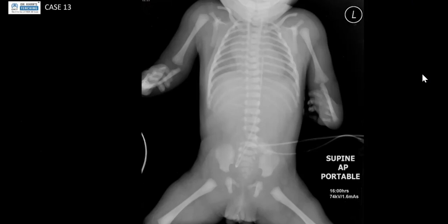I am checking V for vertebral anomaly. Okay, so do you see a vertebral anomaly? I search for it here. I see vertebral limb.